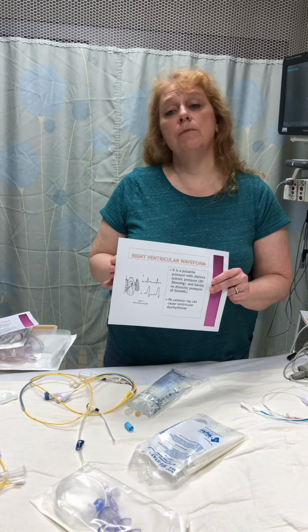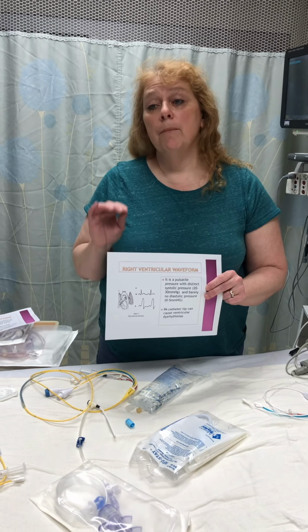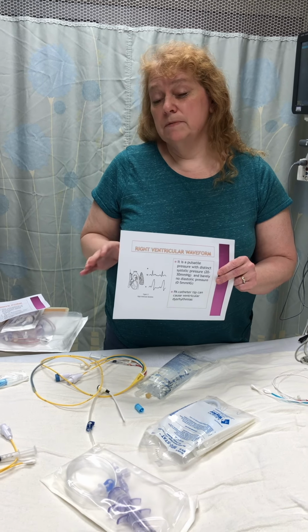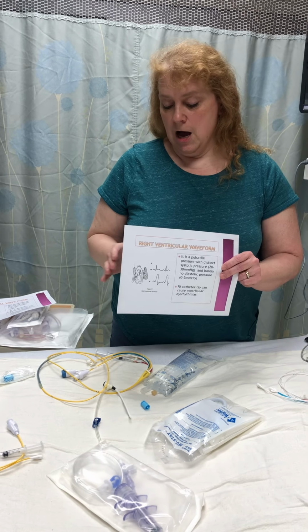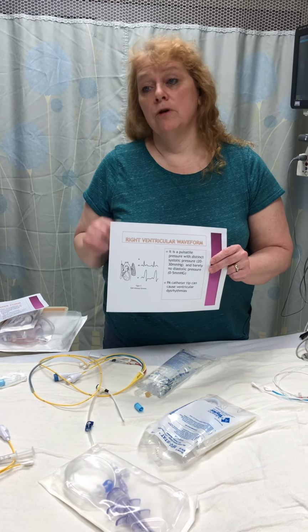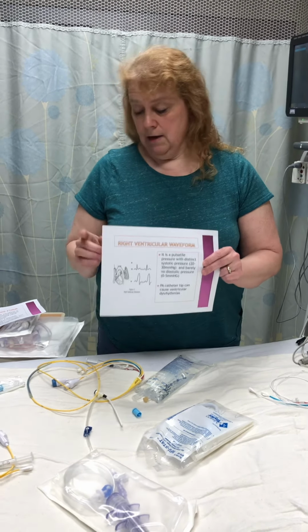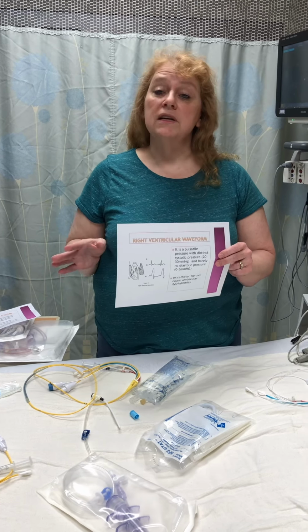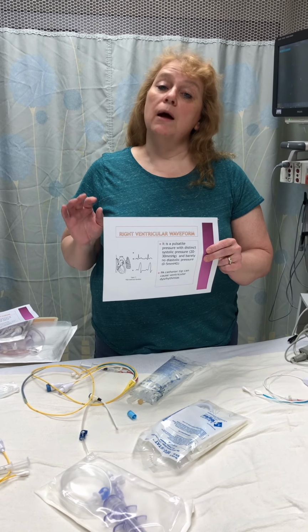Most of the time, the only time you're going to see this is when it's inserted. But this is important to know because if your Swan slips out of place, it'll be important to recognize this waveform so you don't cause further harm to your patient. If you do see this waveform, we now have 24/7 intensivists. Probably the best thing to do would be to grab one of them.